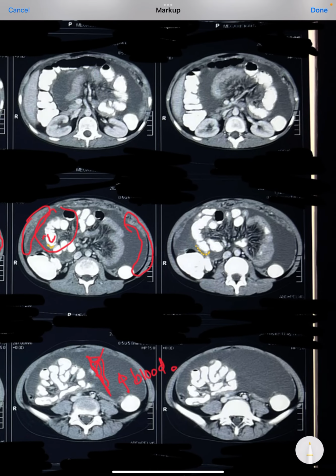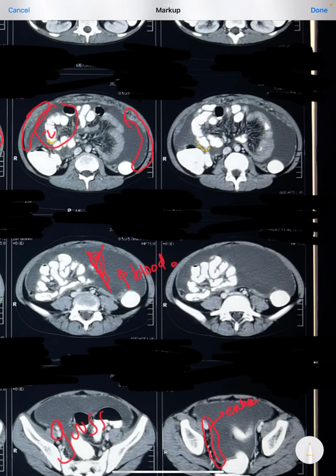It is usually covered by omental fat, or omentum. The omentum is a significant accumulation of fat that allows very smooth functioning of the small and large intestine. Here also you can see subtle whitish enhancement around the omental patches.